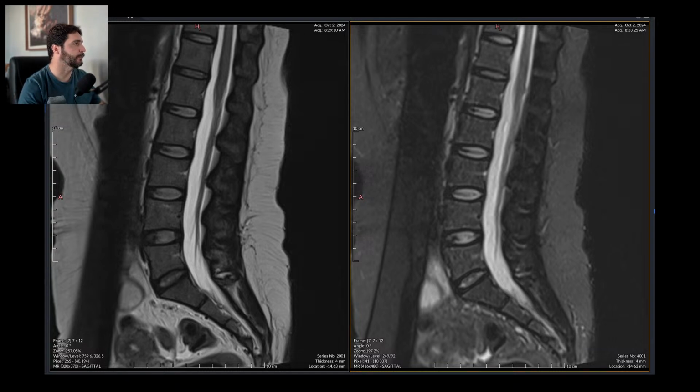And hypertrophy. Yes, and we are done here. Yet another scan properly reported.